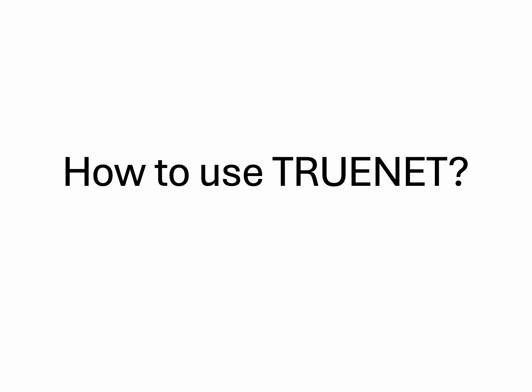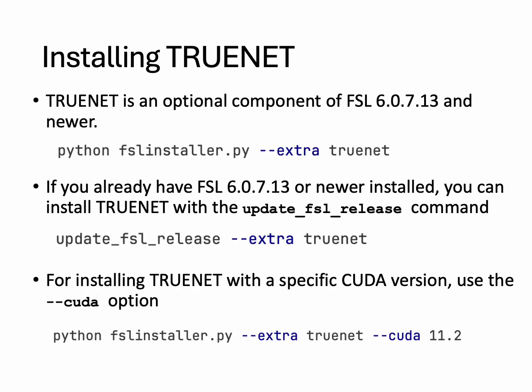Okay, so now we move on to how to use TrUE-Net, the most exciting part, right? So we start with the installation of TrUE-Net. How do you install TrUE-Net? As I mentioned earlier, TrUE-Net is an optional component of FSL, and it's available from FSL 6.0.7.13 or newer versions. So as usual, you install using the Python FSL installer.